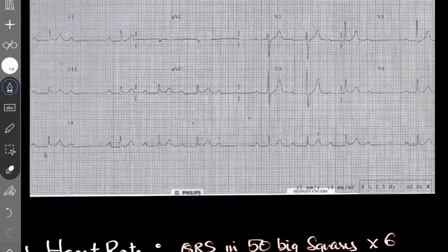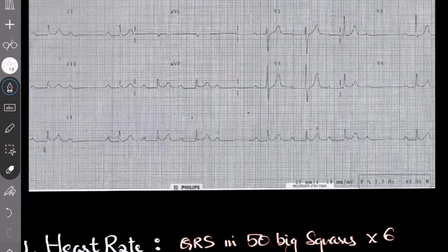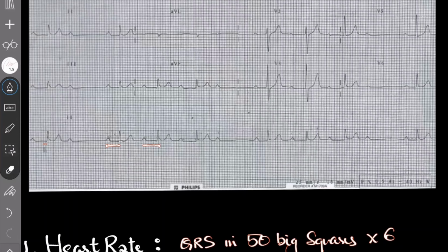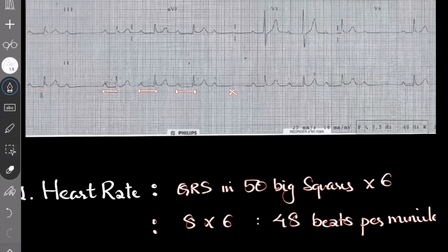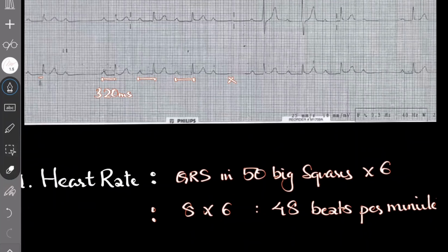Checking the ECG here, you see a P wave, and the PR interval gap is this much, here this much, and then there is a drop. We could say this is 320 milliseconds, here it is 360 milliseconds, here it is 400 milliseconds.